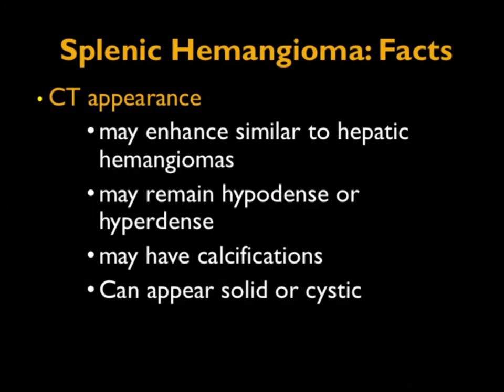Now, I also mentioned in terms of benign lesions, hemangiomas. When we think about hepatic hemangiomas, we talk about a lesion, a couple centimeters in size, enhances in the periphery with puddling, and fills in peripheral to central over time. The truth is, occasionally, splenic hemangiomas can do that. Most of them are sort of these indeterminate hypodense lesions, maybe faint calcification. Not a whole lot can help you.